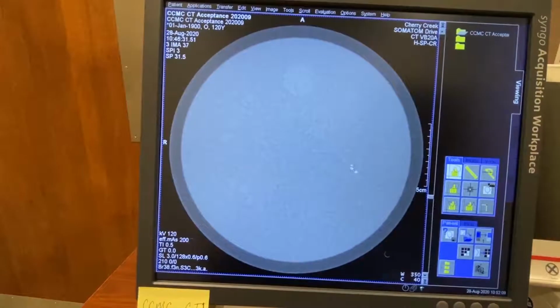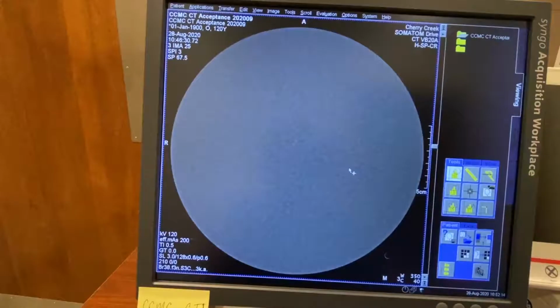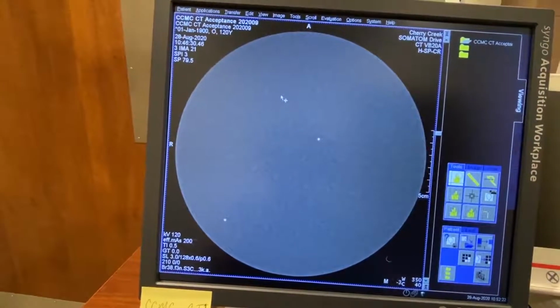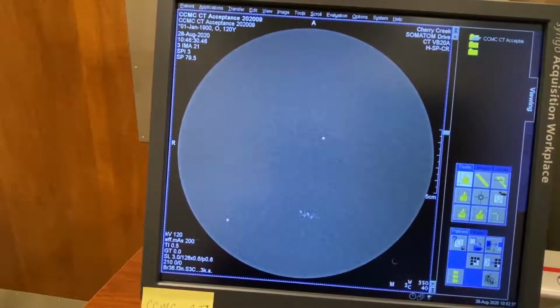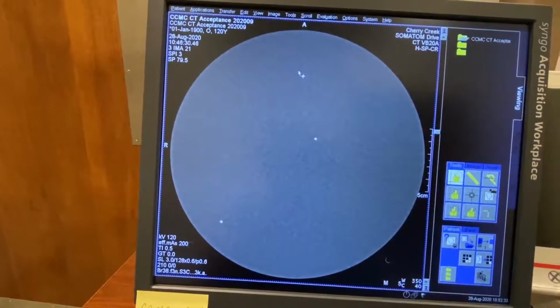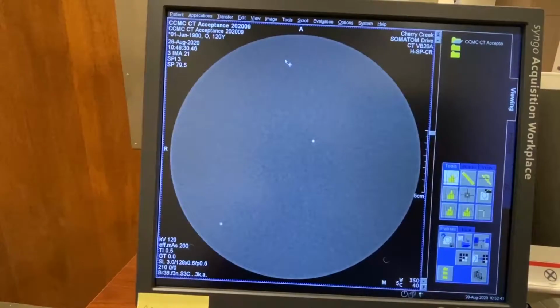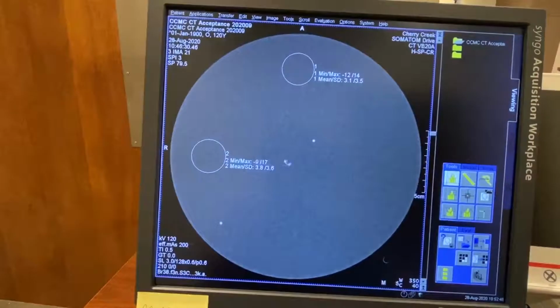So with that, we move to, again, wrong direction, we move to the next module. The next module is a pure water phantom, kind of. It's not water, it's a material similar to water, where we can see if we have any artifacts. And here is a new scanner, and it's actually from a good brand, so we didn't see any artifacts. And then we can measure the uniformity of these objects.